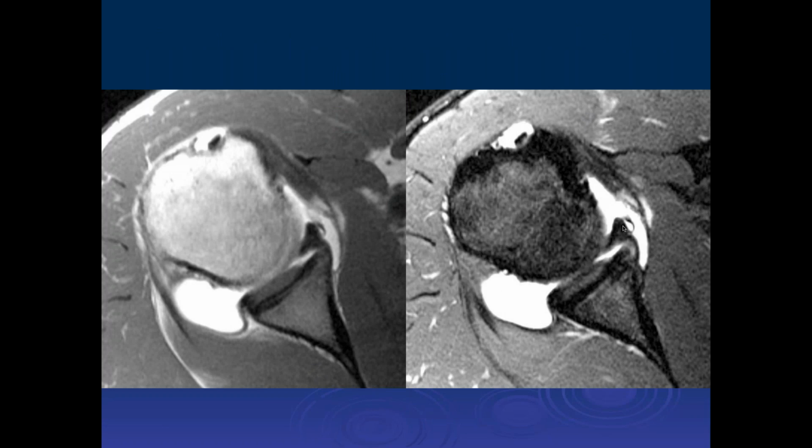And here's another example of the same thing, where we have a tear of the anterior inferior labrum, which is displaced a little bit here, but we can also see that it involves the articular cartilage, where this is an oblique tear in the articular cartilage to the surface. And then I like to give the size of these. And you can say it's a GLAD lesion, but I think it's much more important to describe the findings so it's clear to people what they're going to be looking for when they get in there surgically, rather than just saying it's a GLAD lesion and not really describing the findings and measuring the findings.